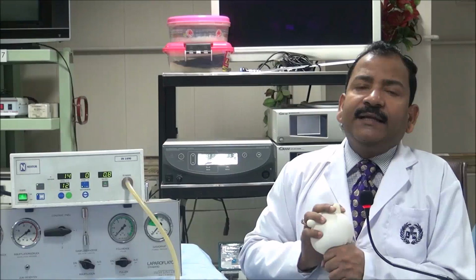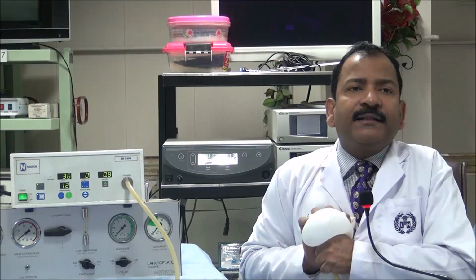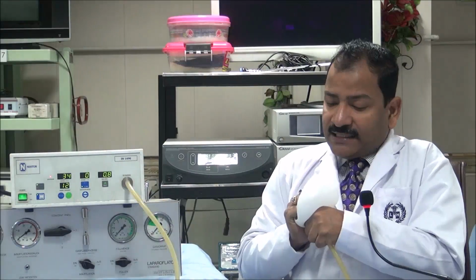Now, the question is, why has it not taken the gas back immediately? When the pressure was there, after 5 seconds it gave the alarm, and it waited again 5 seconds and then it took the gas back. Why? Why didn't it do it immediately?